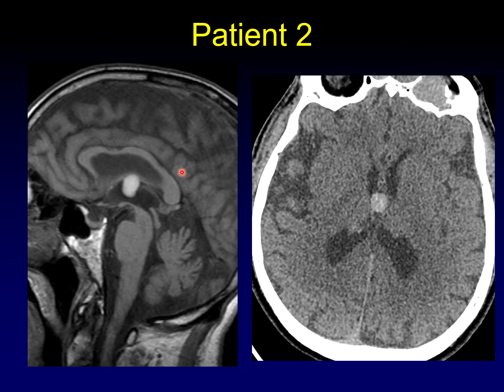Well, here's your answer. Just to be fair, I'm going to give you a SAG T1 on this individual as well, and you can see that that's actually intrinsic T1 signal you were seeing on the post-contrast image. And here it is on CT, looking a little more dense than patient one's lesion.